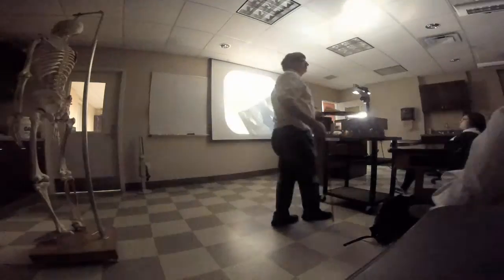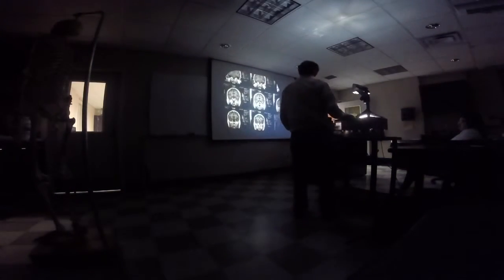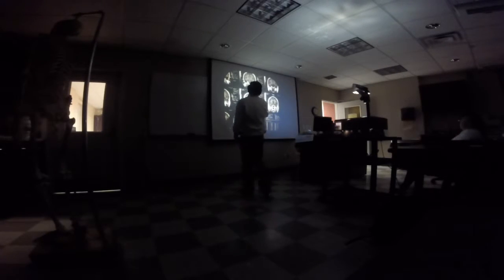Oh, really? It's way back there? Yeah, it's a little bit more posterior than you would think. I was trying to find it on the brain, but I couldn't. Seriously? Like the fifth time, like fifth hour. Okay, what is this passageway here?